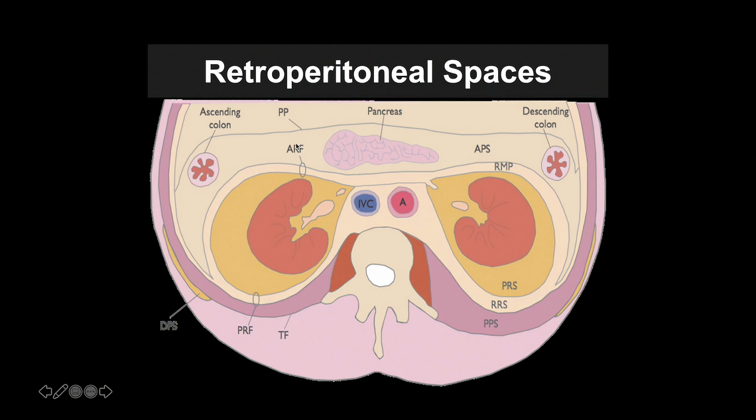Also portions of the duodenum, the second and third portions of the duodenum that surround the pancreatic head, are also in the anterior pararenal space. And this anatomy is clinically important. In a patient who has pancreatitis, for example, and inflammation surrounding the pancreas, you may only have subtle inflammation that tracks along this anterior pararenal space and along the anterior aspect of Gerota's fascia. And this might be your only sign of inflammation of some structure in this anterior pararenal space.